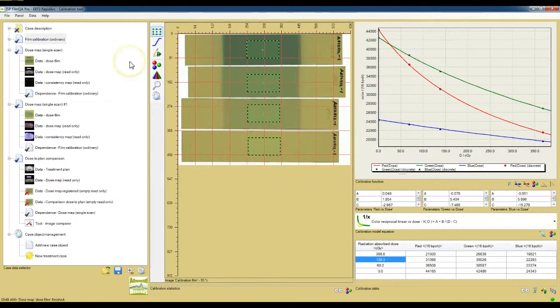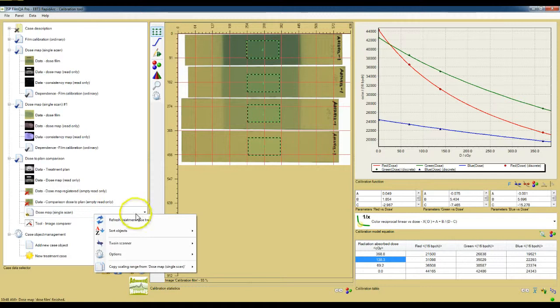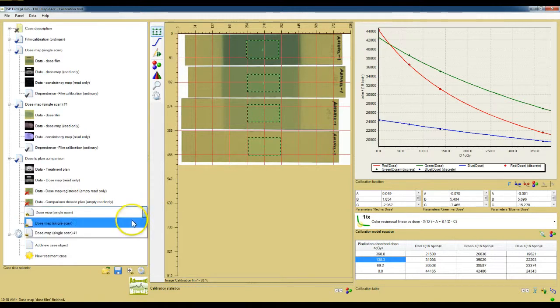A case tree could contain any number of case objects, including multiple objects of the same type. In this case, be aware of dependencies. Every dependent case object has a line where you must specify the dependency. By default, any case object is dependent on the first instance in the case tree. So check the dependencies when there are multiple case objects of the same type.